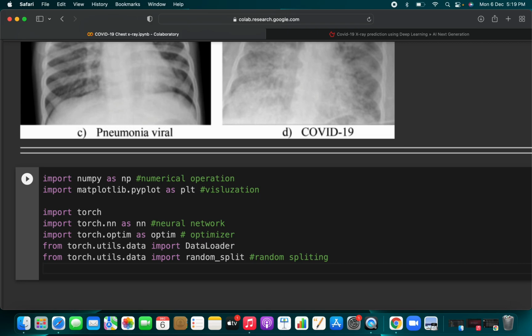Now we will use the torchvision library. Everything we have imported so far is from torch. Torchvision is not another separate library, it works hand in hand with torch. Whenever you are working on images or videos data sets, in that case you are going to use torchvision, because torchvision contains transforms. Whether you want to resize your image, do image augmentation, or shift horizontally or vertically, those are part of image augmentation. You can do everything in torchvision. Even all the pretrained weights are there in torchvision. Okay, you can directly use the torchvision library.